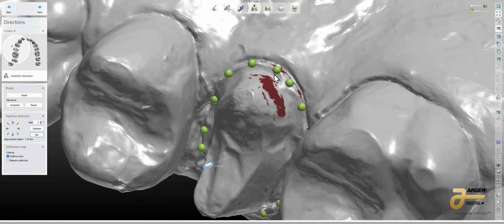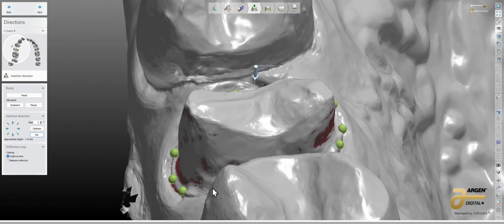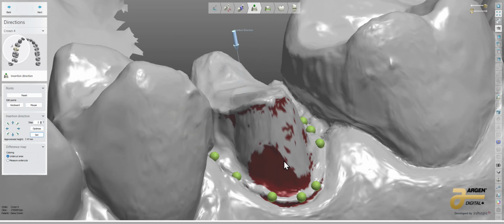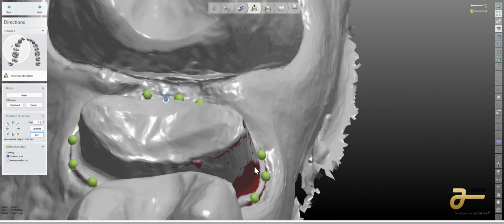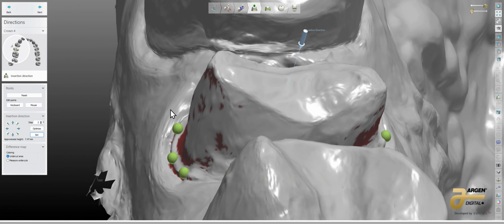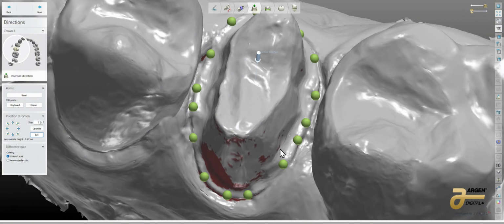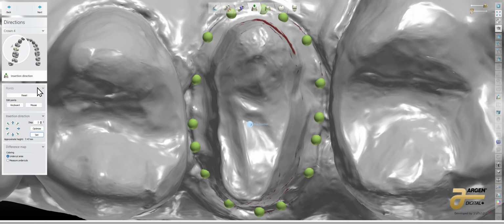Now let's look at much less here, a little bit on this aspect here. Where's the most critical part for a crown? Well, it's on the facial, right? So, is this more advantageous than the optimize? Well, that's up to you, and it has more to do with how it's been prepped. But I show this to you not just to rely on clicks and try to get through it. So let's go ahead and say this is okay.